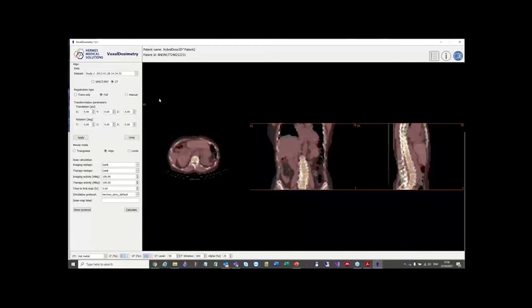So, quite a familiar scene from Lara's presentation. What we're doing, the first step, is to align these 3 time points. We can choose, as Lara described, to do a CT to CT alignment. What we're looking at here is a little tricky to visualize inside the application, but I've got a red version of the CT of the second time point floating over the first time point.